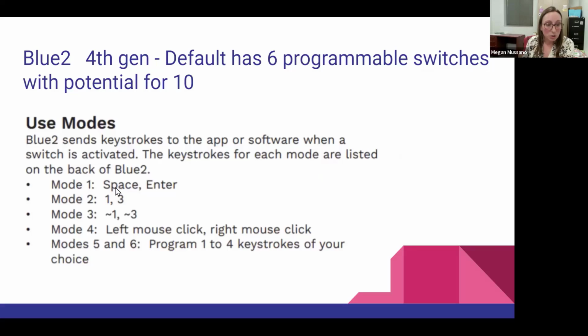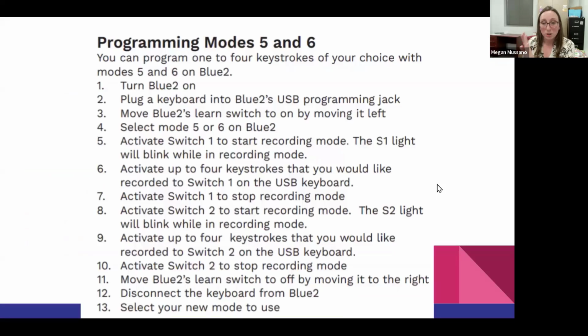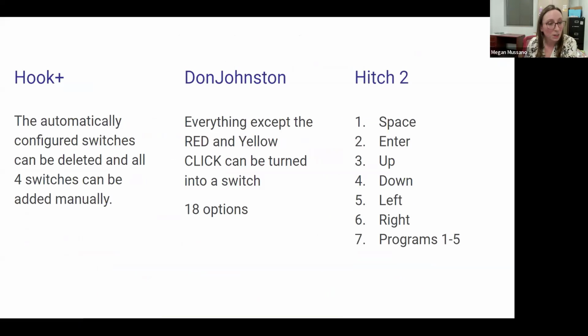For example, right now you can do the space and the enter can be programmed, the 1 and the 3, and I think even this level, but mode number 4, like level number 4 that has the left and right mouse click, you can't program those because the iPad doesn't register mouse clicks as a programmable function. So the first 3 modes are the ones there. If you want to program more, if you have the Bluetooth, you can look at this, but don't look at this unless it's relevant to you because it's extra.